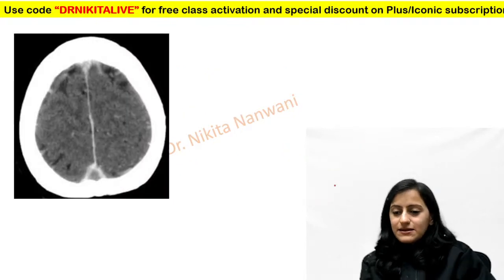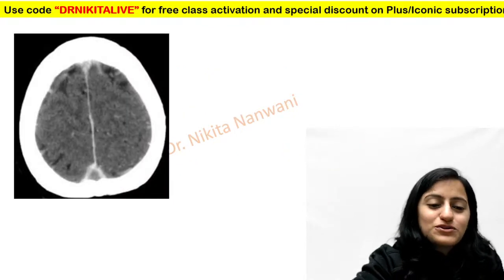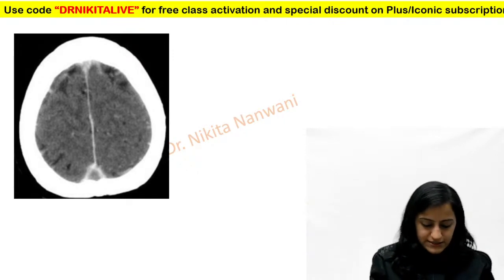Next one, let's see who's able to answer this first. What do you think is the sign which is shown here? What is the diagnosis?